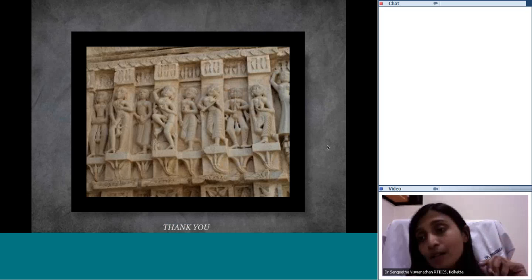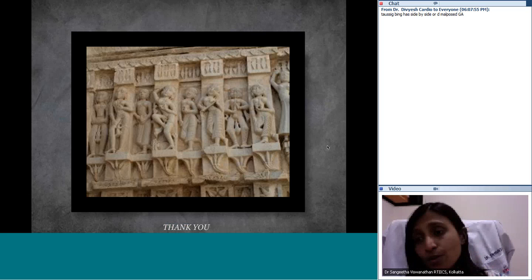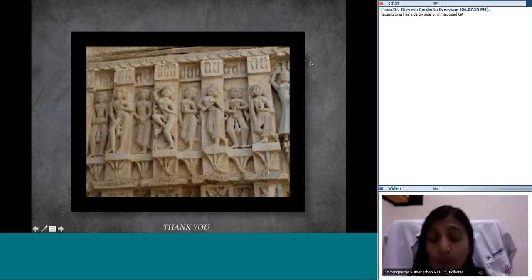I haven't really, obviously it's important to look at things like branch pulmonary arteries, coronary arteries, especially when you're planning to do a tetralogy type repair. You have to look at coronary arteries. So all these other factors, the arch, all of these have to be looked at. But the talk was focused more on the DORV, specific DORV aspects.